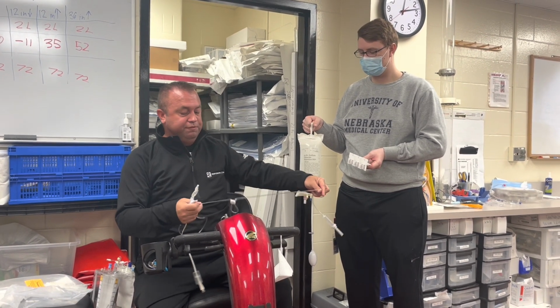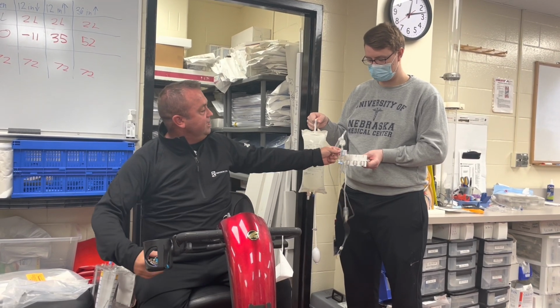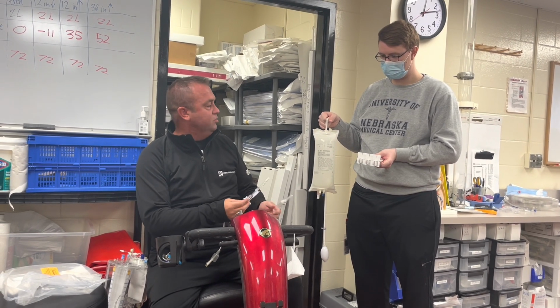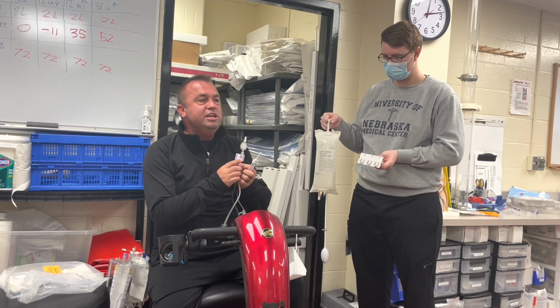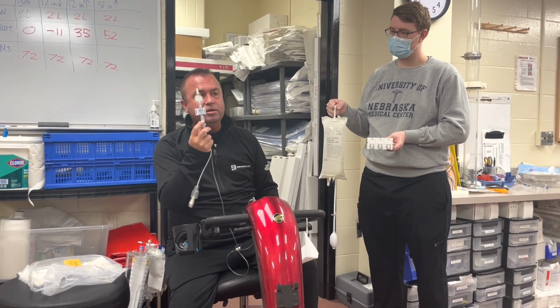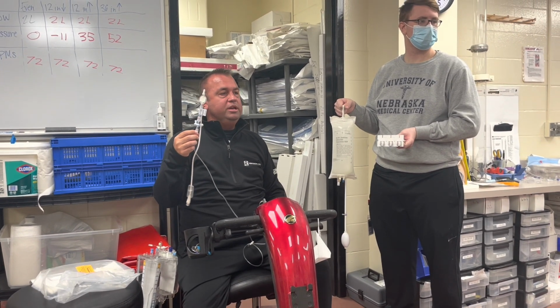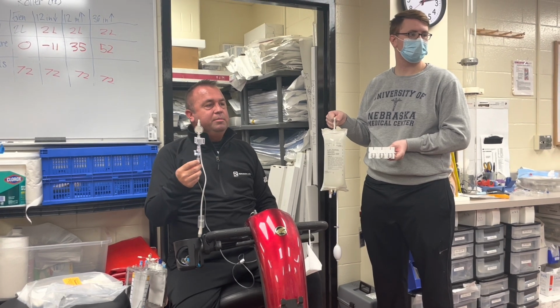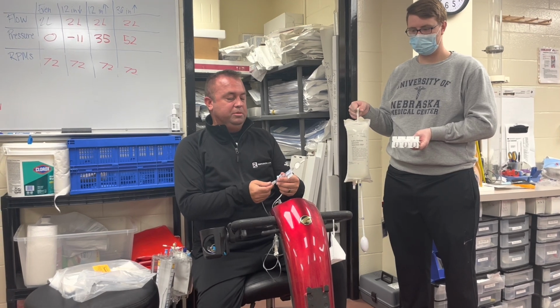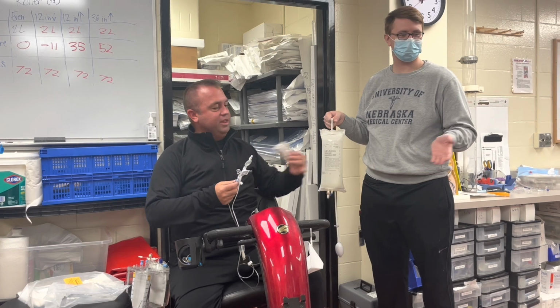Here is the fluid spike. The transducer will fit in a clip. Of course, we probably have a different clip than what this one shows. Usually there is a direction of flow on the transducer. If you look behind Zoe, there's a clip, there's a couple of them set up. You see how they're upside down, Zoe? To where the top of it, yeah, maybe bring that one over here and we'll give it to our IV pole and we'll show that one instead.